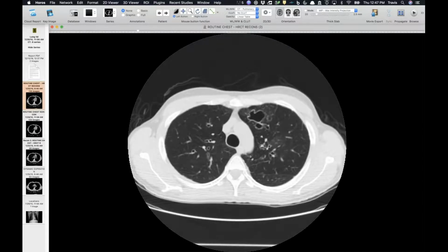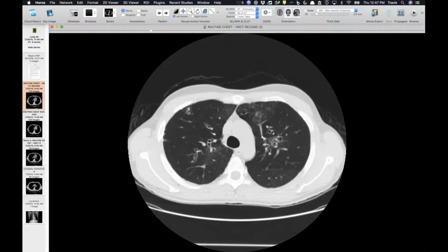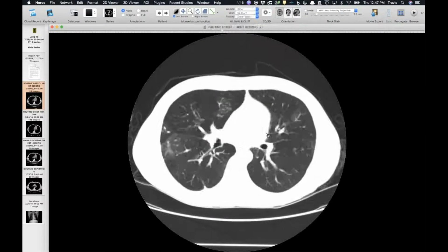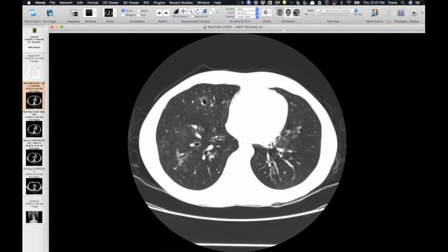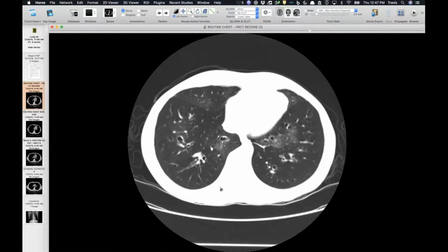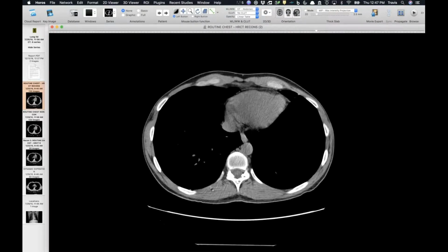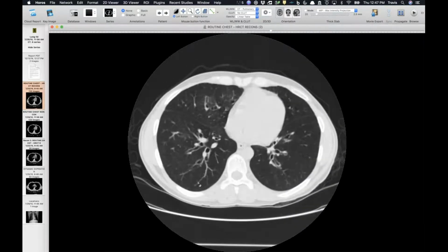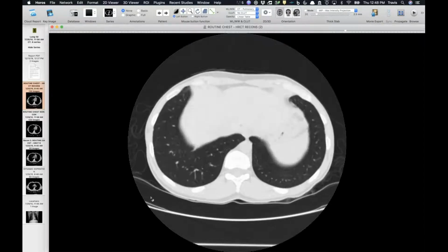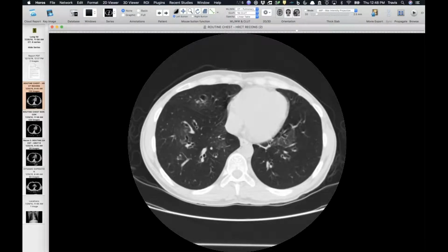But this ties into Howard's case, that we see that there's some bronchiectasis, and it's more severe in some areas, some cystic bronchiectasis. But you can see just the diffusely decreased attenuation in some areas of relatively normal attenuation. So mosaic attenuation, severe obstruction, severe obliterative bronchiolitis. And the reason I even went back and looked at this study was the history. And so, David, you mentioned gold as a cause. Another rare drug, this guy wasn't on gold, but you know other rare drugs that you include on that list of obliterative bronchiolitis.